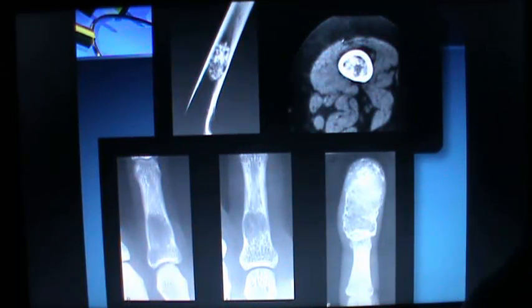Mottling, calcification within the bone, within the marrow, some expansion, some cortical thinning, but no destruction, no periosteal reaction, and there is a risk of malignant change. That's why any chondroma should be removed, because of this risk of changing into a malignant process, chondrosarcoma.